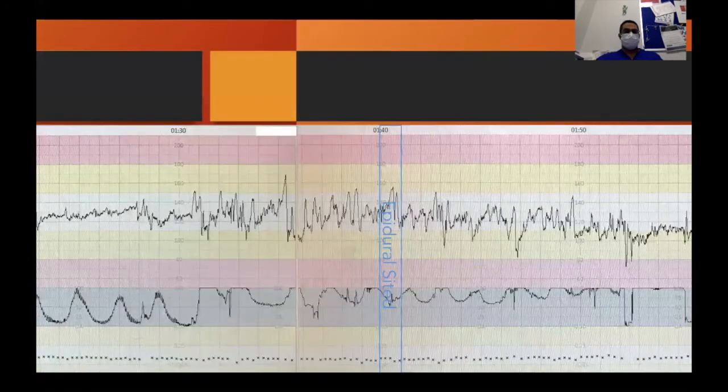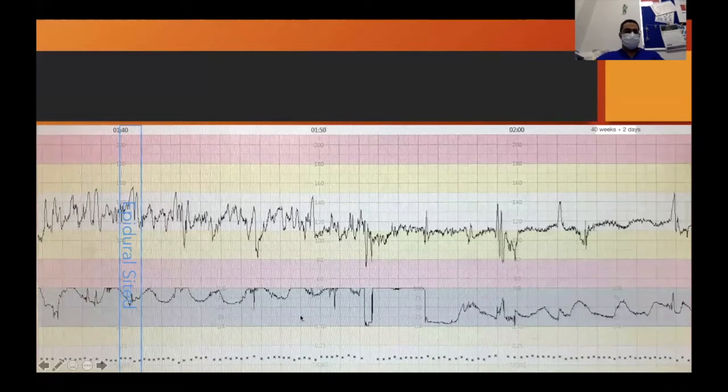Cool. Now, the other thing that you would have noticed is that they had started her on STAN. We are going to talk a bit more about STAN in the near future. We'll talk about how we manage STAN, especially because we here are using slightly changed, different guidelines for STAN that we've managed to work with and improve. Okay, so baby seems to have a stable baseline.